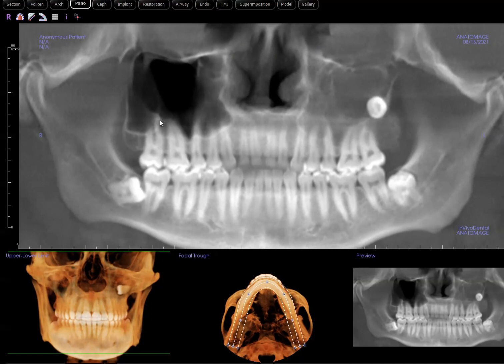Also, look at the radiodensity of the maxillary sinus. Here it is very radiolucent, suggesting this sinus is clear and well aerated. However, when we look over to the other side, that is radiopaque. Furthermore, we can better appreciate the bony outline of the maxillary tuberosity. Yes, we can see it, but it doesn't have that nice, thin, corrugated outline that we see on the right side. We see some radiopacity, but is this really bone or is it not?